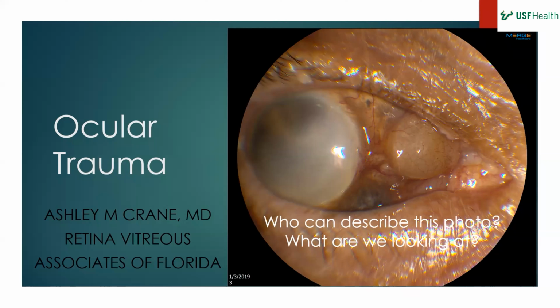So described that there was a nasal cyst here on this exam. So can somebody, anybody want to take a stab at what we're looking at? Is the globe ruptured and then either vitreous or silicone prolapsed under that conjunctiva? It's a good thought. Anybody else?